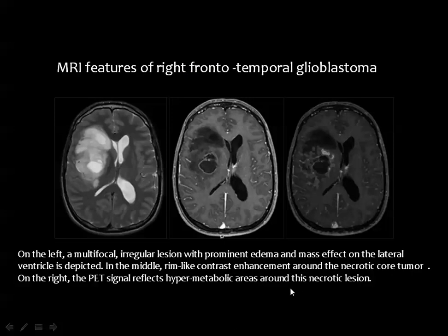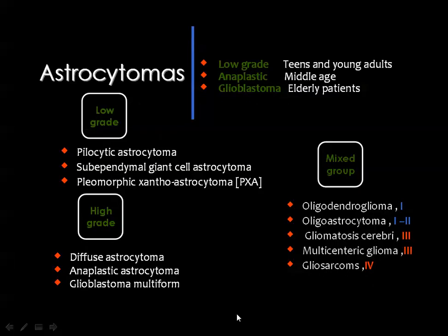Another case of glioblastoma multiforme, and you can see the enhancement pattern of the tumor. Then we finished with the three types of high-grade gliomas, which are the diffuse astrocytoma showing no enhancement, anaplastic astrocytoma shows dots of internal enhancement with no evidence of breakdown or hemorrhage, the glioblastoma multiforme showing aggressive appearance with enhancing margin of non-uniform thickness, or heterogeneous pattern of contrast enhancement.